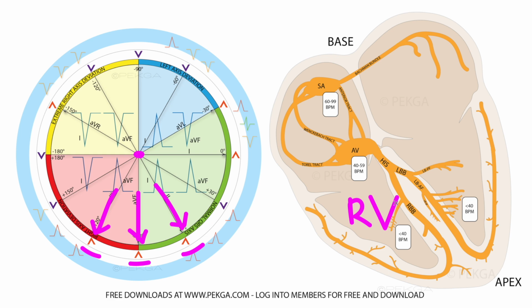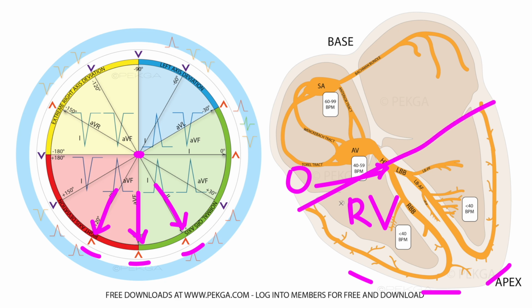So what that tells me, looking at lead 3, lead AVF, and lead 2, along with lead V1 having left bundle branch morphology, meaning the signal is moving away from V1, is that this ventricular tachycardia is originating somewhere in the basal region of the right ventricle. So somewhere up here.